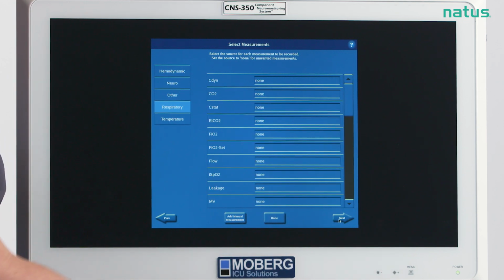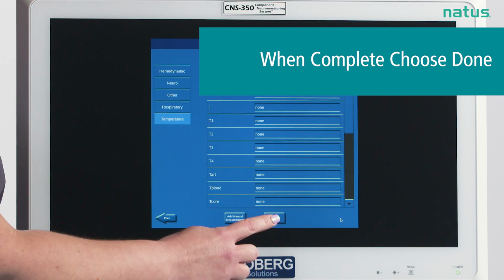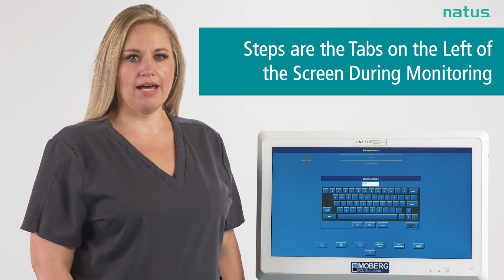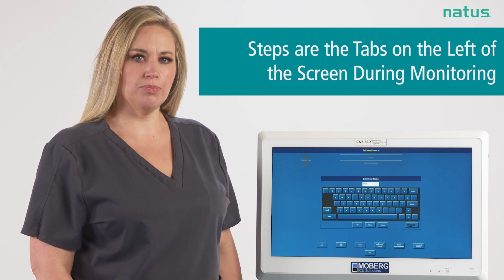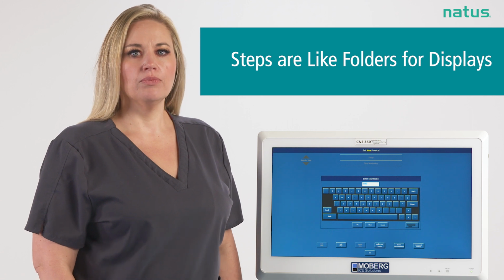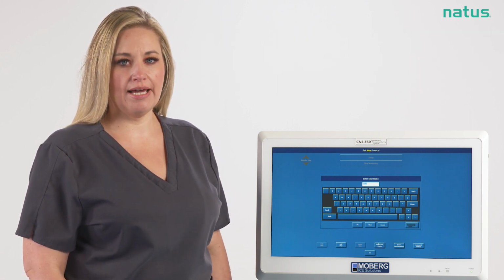You will do the same for respiratory and temperature as well. Once you are sure you have added all of the measurements you want to include in your protocol, tap Done one last time and you will come to the Enter Step Name screen. These steps are the tabs that you will see on the left-hand side of the screen during monitoring. You can think of steps as folders that help you keep your various customized displays organized. We're going to type in nursing to keep it consistent with the other protocols and tap OK.